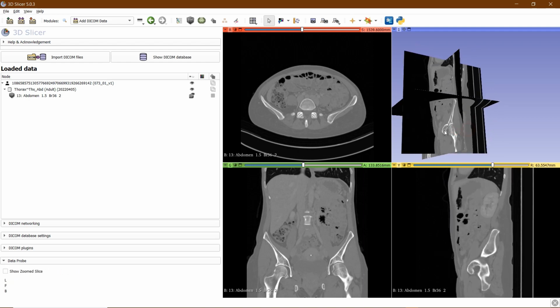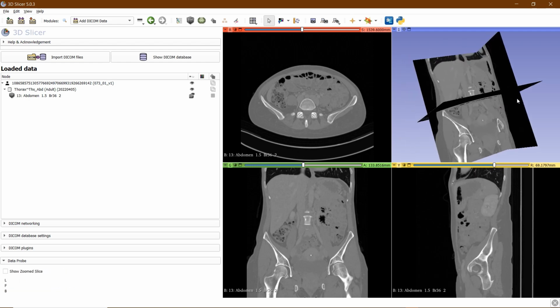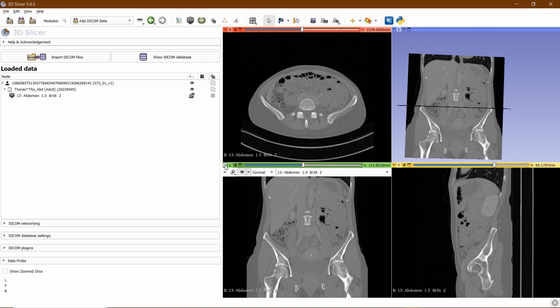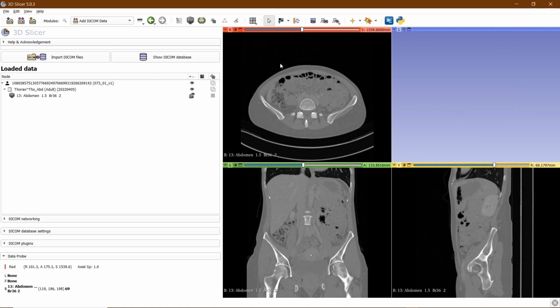It's possible to scroll through the planes and move all of them together in the 3D view to get a view from all perspectives. It's also possible to deactivate their three-dimensional visualization again and return to the standard two-dimensional view.